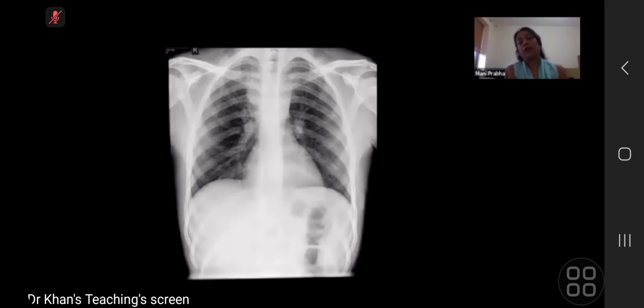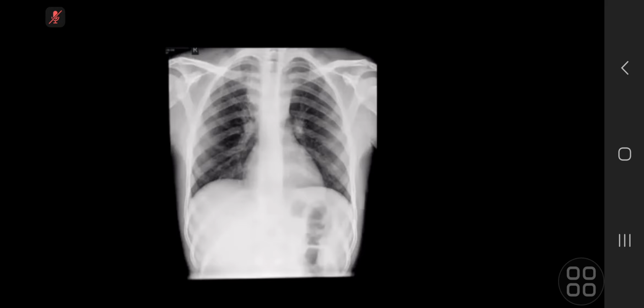And any radiological investigation you would like to consider with this kind of appearance? So the patient may need cross-sectional imaging, although they're a child. Depending on the symptoms, if they have symptoms of TB with night sweats and or weight loss, then I'd recommend a CT to confirm.